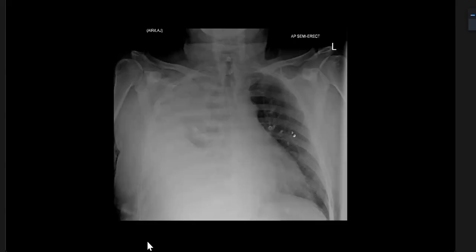The next thing you ask is, is there a history of trauma? I cannot see any rib fracture, but someone who has acute shortness of breath, trauma should be considered. The examiner may say, I don't know, or the examiner may say, no history of trauma. Then you kept digging, and I kept asking, anything else you can see? If I'm asking you anything else, I'm giving a hint. There's something else. Could you see these nodules here?